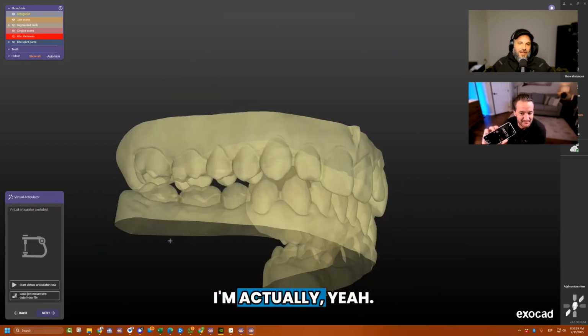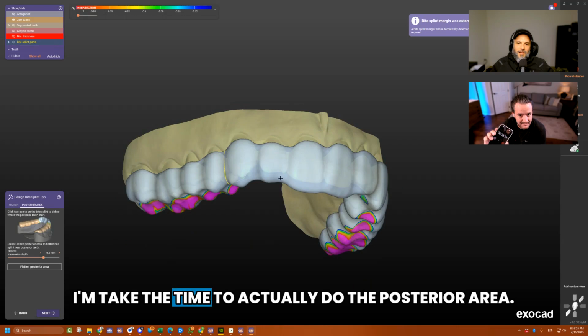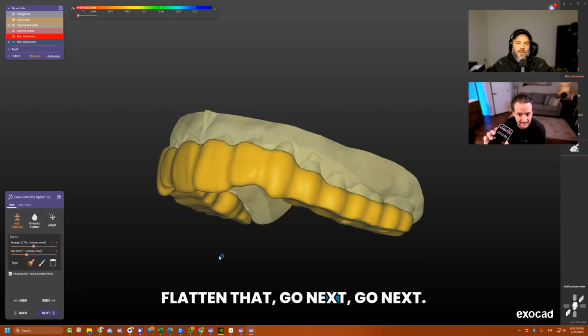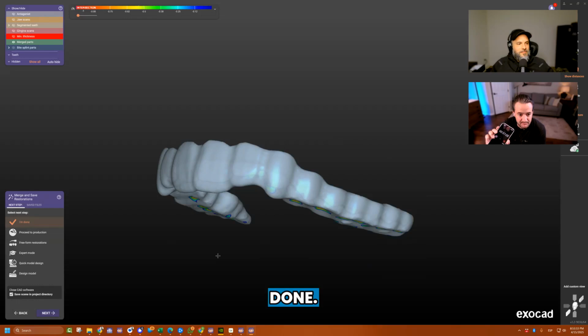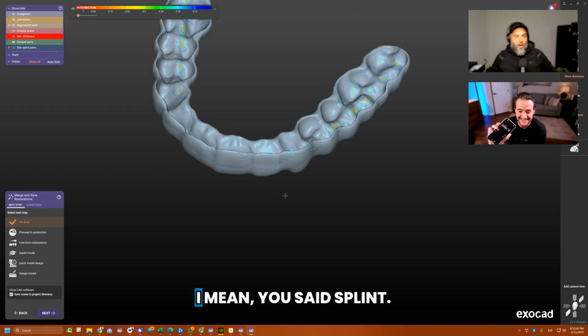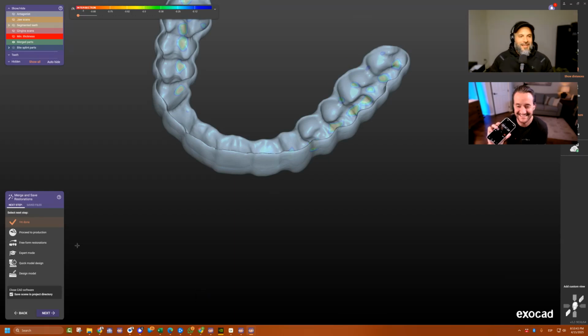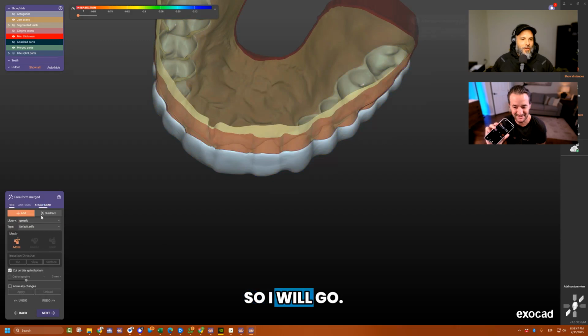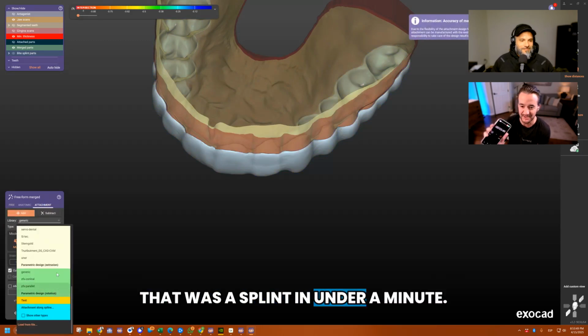So I'm actually taking the time to do the posterior area, flatten that, go next, done. Stop it. That's 35 seconds. Stop. You're not done. What about the deprogrammer? Come on. I mean, you said splint. Oh, well, but here, let's do the deprogrammer real quick. It will go. So that was a splint in under a minute.